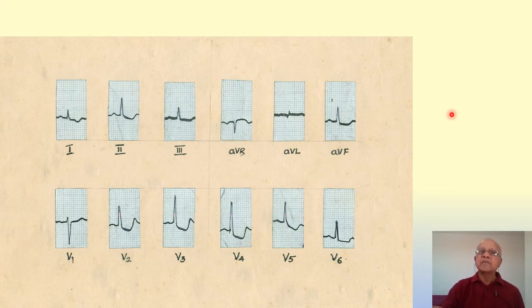He had chest pain when he came upstairs to the outpatient department. Now this change you will see in a patient while doing a treadmill stress test. This type of ST depression, especially downsloping, you may see in patients when you do a treadmill test if it is positive. Now when the patient takes rest after the test, the ECG becomes normal, right?